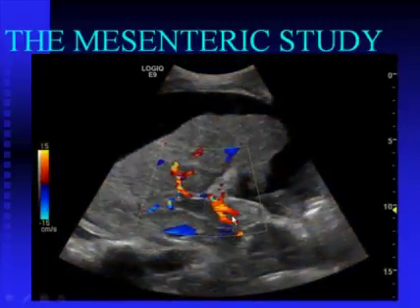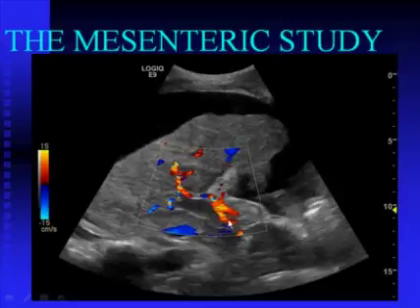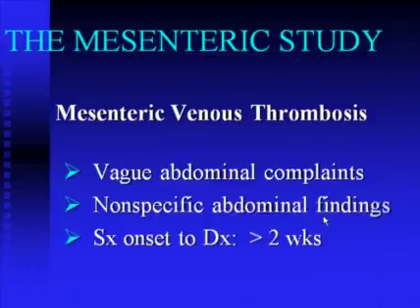You may have cavernous transformation, some recanalization of the thrombus, some collateral flow providing flow into the liver, but again, the main portal vein remains essentially thrombosed and non-functional at this point. And it's just a matter of making that identification and documenting that specific finding.